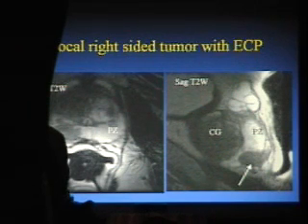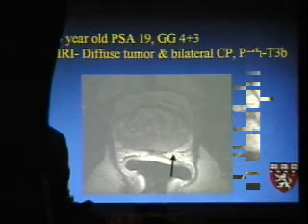Sagittal view, extremely helpful here too, to confirm that. And two or three planes is really useful. Sometimes, inevitably, kind of Murphy's Law, one of them won't work, or one of them doesn't come out right, or the patient moved, or there was a wave of peristalsis right through the area that you wanted to look at. And so having the three views is really very valuable. So you can see the extracapsular disease there.